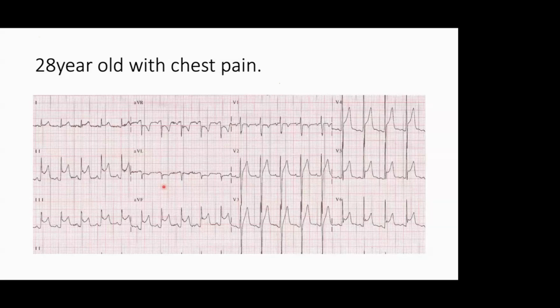Sinus tachycardia. There is global ST elevation seen. And you can see the ST elevation pattern. I already told you, the ST segment will merge with the T as a dome, that is convex up ST elevation. In this, you are not seeing that convex up. It's not merged as a dome. It's merged as a U. So it's not a typical ST elevation we are seeing.